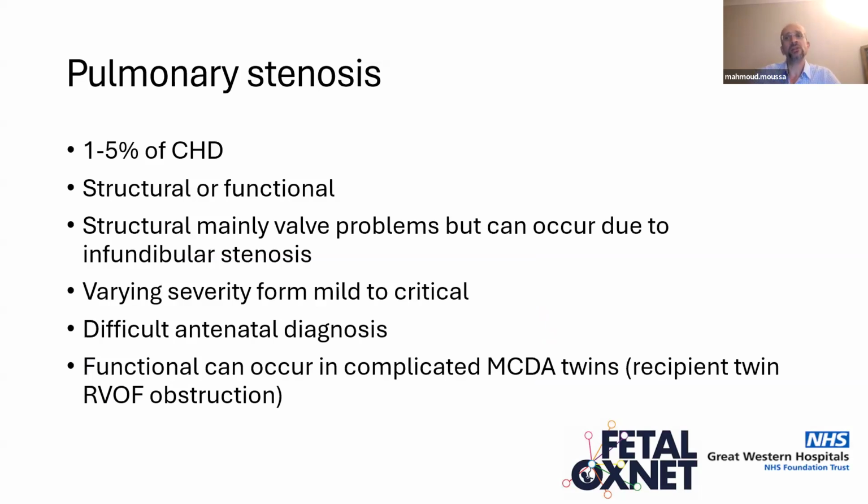The pulmonary stenosis can be either functional or structural. If it's a structural problem, it's mainly the valve itself, although you can get problems either below or above the valve. It can be very mild, in which case you're most probably not going to be able to diagnose it during pregnancy. The critical ones, you should be able to get in pregnancy if you do the right thing.